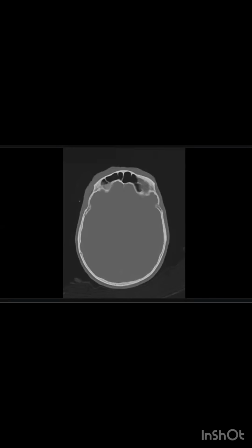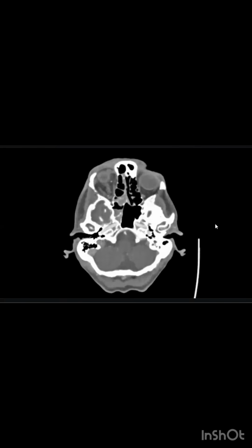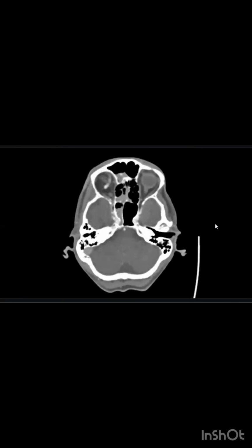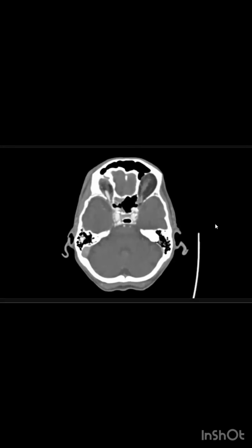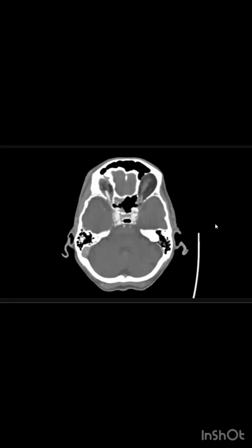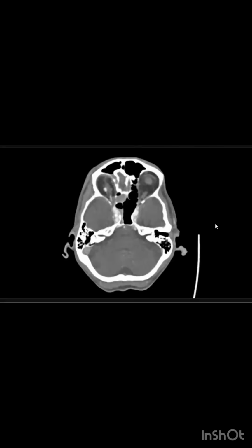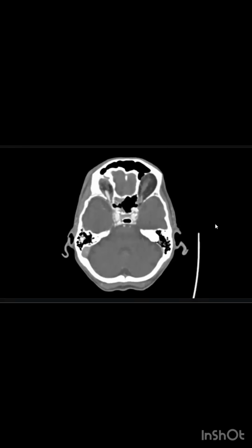We did CT with contrast for this patient. Please scroll through the images and give me your final diagnosis. This is the post-contrast CT orbits and brain. The previously described elongated structure in the superior aspect of the right orbit now shows significant post-contrast enhancement, extending to the orbital apex, and no such structure is noted in the left orbit.